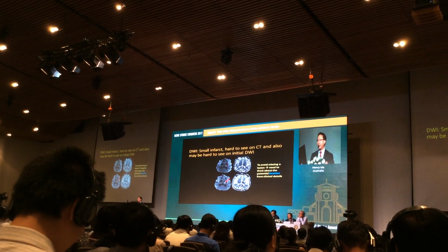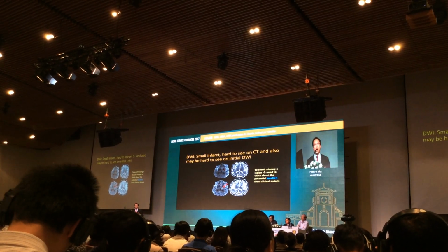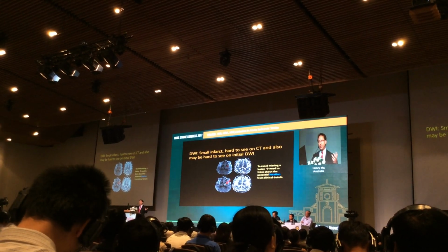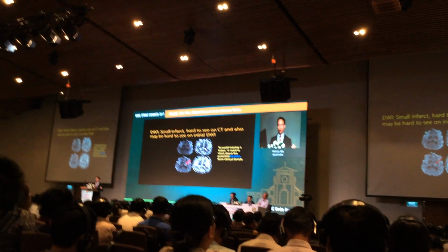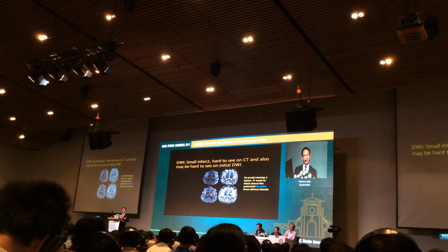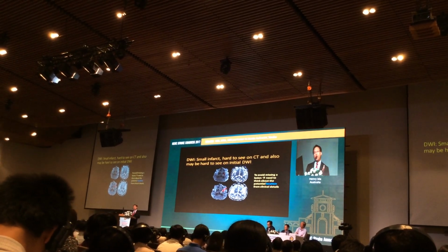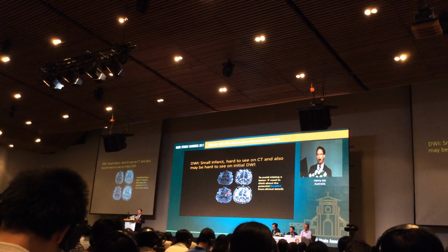So this is a patient, again, you think you've got right arm tingling, the patient has a history of migraine, history of psychiatric illness. You put them in a scanner, you suddenly find there is a thalamic infarct, and that actually solves your question. But more importantly, the initial one is actually very faint. With time, that actually gets better. So therefore, you've got to put a time factor in it. When you do the scan very early, you've got to look a lot harder.